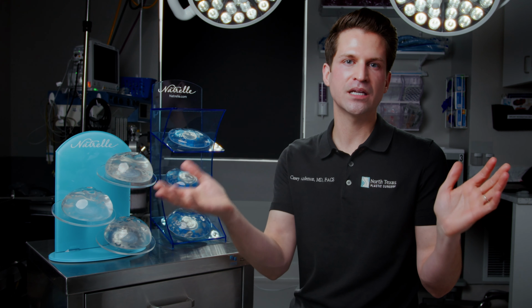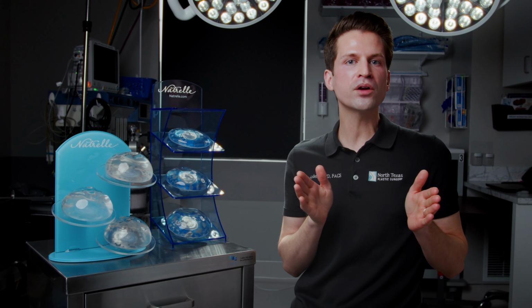From that point, we'll make 3D imaging to kind of confirm outside of the bra that size. Let's say you pick 415, that then when we do a 415 on the 3D imaging, that's also looking close to where you want to be. So if you come in and you're 4'10" and you weigh 89 pounds and your frame is like this and your base width is like this and you want 400 cc's, we need an implant that is going to be relatively within the confines of that base width, so it's going to project more forward, versus if you're 5'10" and you have a broader rib cage, you're going to need an implant that's wider to get to that 415. Therefore, it's not going to project as much.